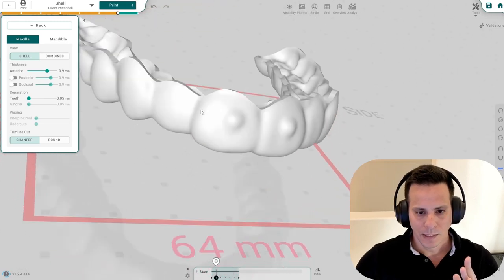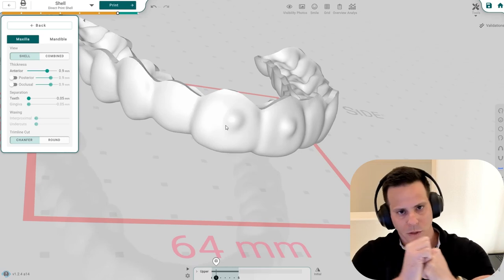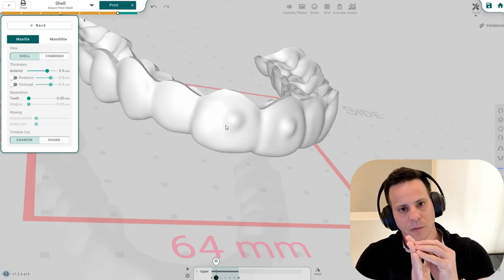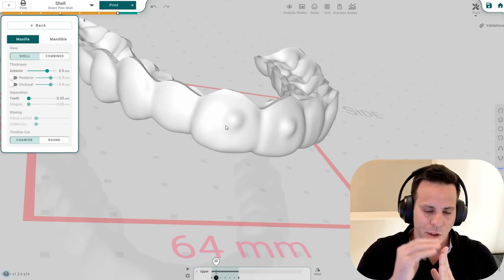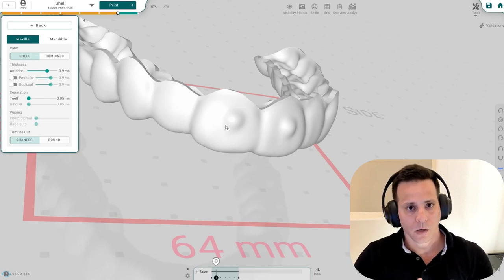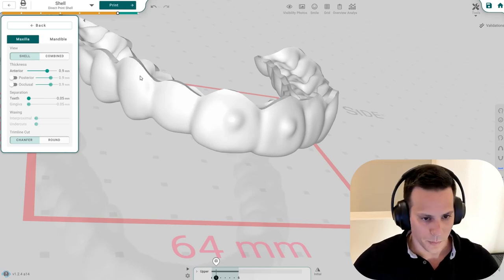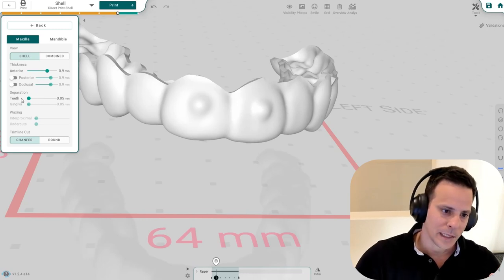That way, over here on the teeth, it grips and holds so that it can move it. But where it meets the gingiva, on the gum surface, it's spread out, it flares out, and that way it doesn't touch the patient's gum as much, and it can be more comfortable for him. Again, this is going to be a per case setting, so it will depend on the patient and your settings, your comfort, things like that.